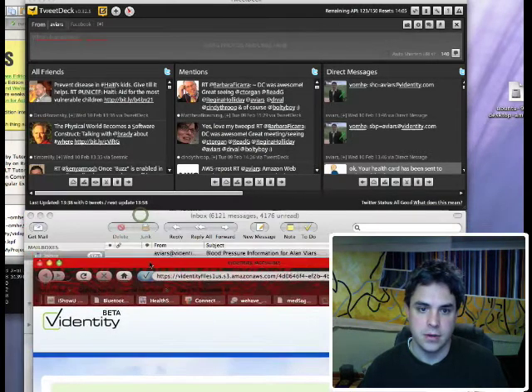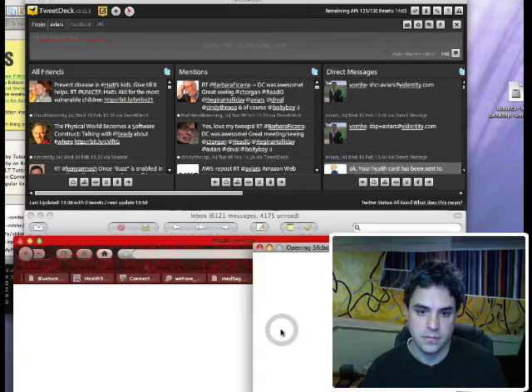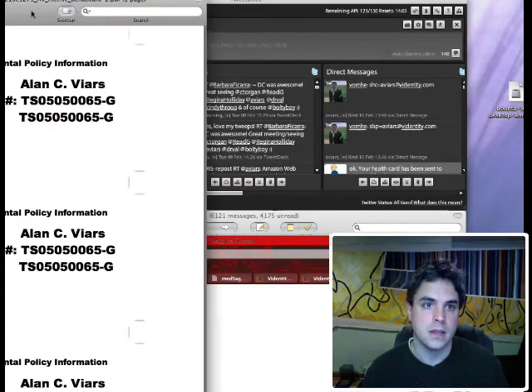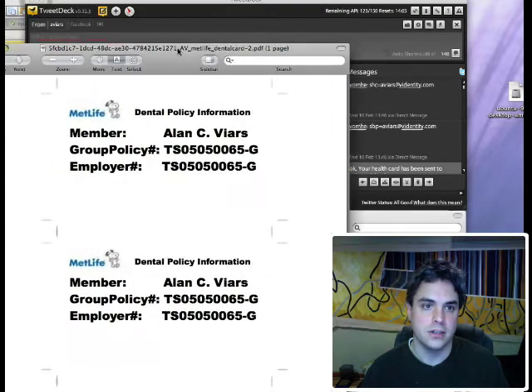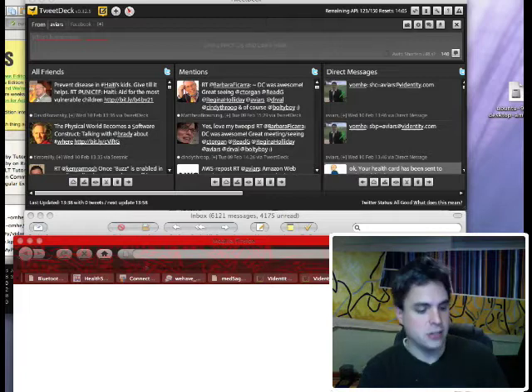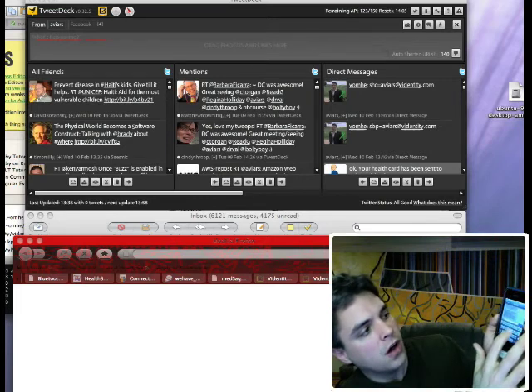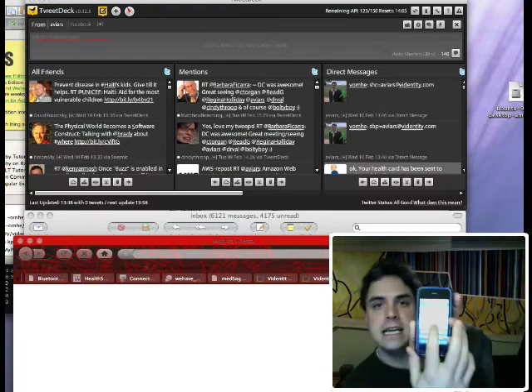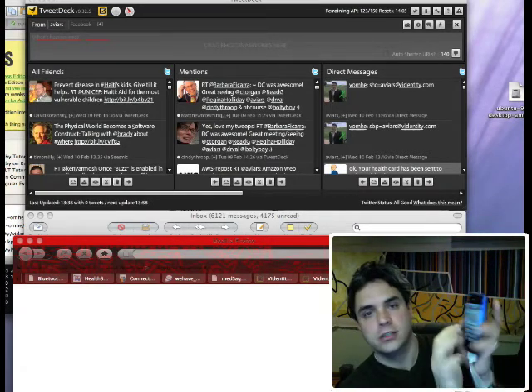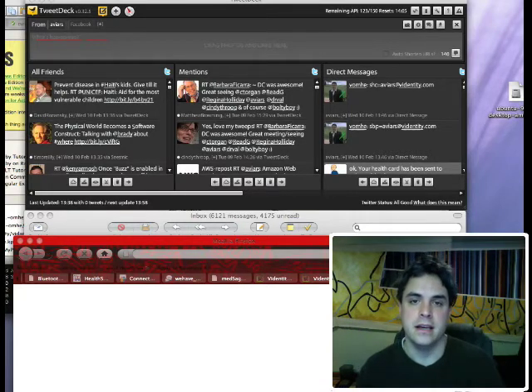And as a similar example here, we'll look at the insurance information. And here's a copy of my insurance card. It was sent the same way. And we'll also see where it actually returned my blood pressure via text message. So it's actually sending out the details of the blood pressure in a short text message and also sending the URL in the same way.